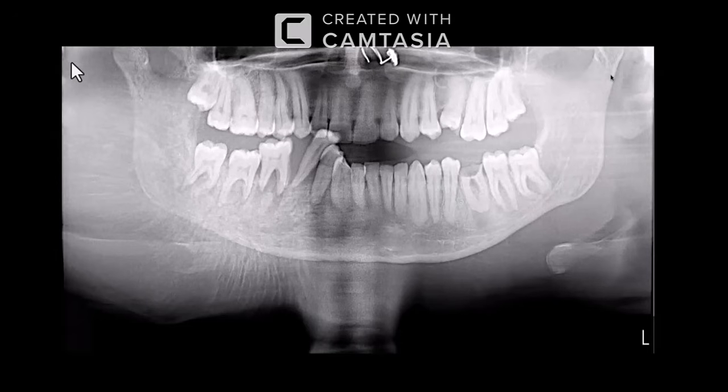Can you look at the cortical margin on this side, on the left mandible, quite sharp and very nicely outlined. Look at the right side, even though the margins are sharp, can you see these periosteal, sunburst kind of periosteal reaction? Yes. Can you appreciate? So this is actually a quite large soft tissue. Unfortunately, the soft tissue is too much, I think they couldn't cover it completely.